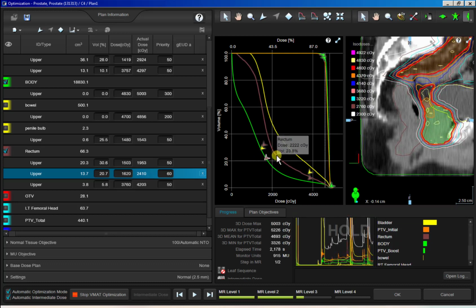So now if we look at V22.5, somewhere around here, you know, it's falling a little bit. That's good. We don't need it to fall too much, because if we're under 25%, right, I'm just trying to give myself a couple of percent wiggle room in case we need to normalize a little bit or something like that. So literally just a small change is all you need to do. If I was still close or still failing, I would then just bump it up another 10. So just literally 10 at a time, okay?